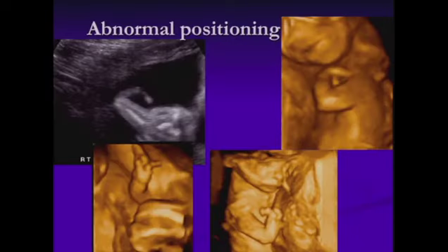But here, when you have abnormal positioning, and this is getting to that arthrogryposis type of case, again, the 3D can be very helpful. It can be sometimes difficult to get an entire extremity on a single 2D view, and when you get that 3D, it can really be helpful. And in a case like this, it really helps you understand the anatomy better. You've got kind of a foreshortened humerus, definitely radius and ulna are almost absent, and then you've got these hands held at an awkward angle.